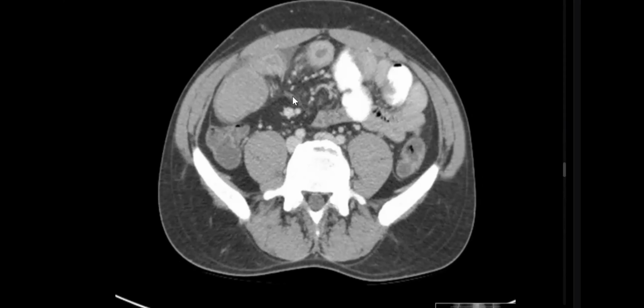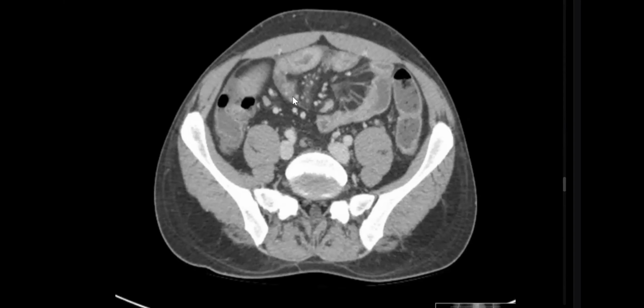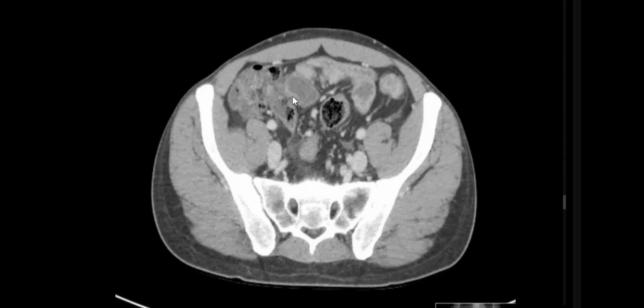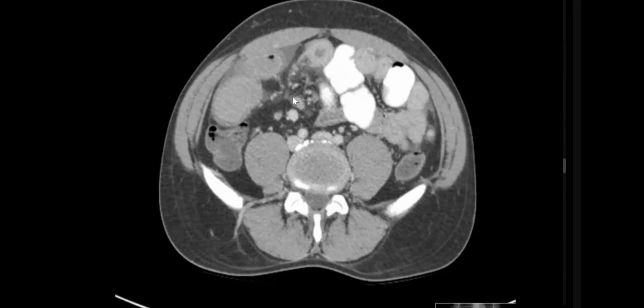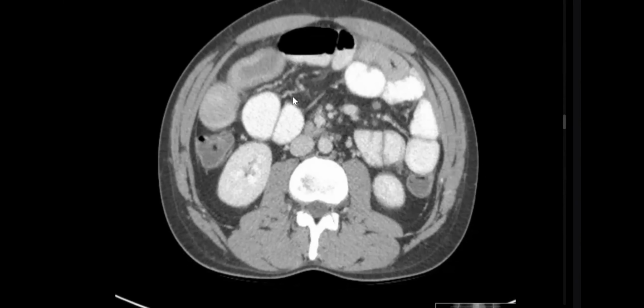I'm just trying to determine the proximal and the distal ends of the bowel. One second, please. Take your time. So it is here. This is the distal, and then it is collapsed with thickened appearance of the wall, and then it is dilated here.